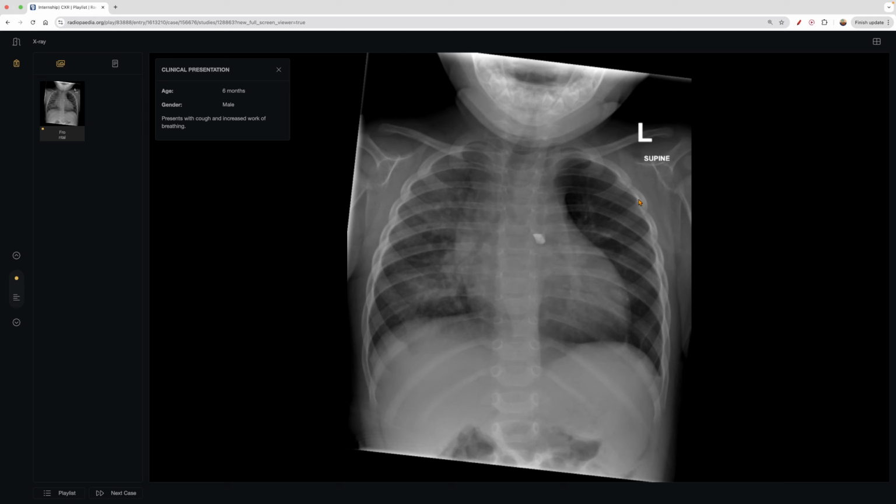And so with that being said, you can see this lung looks a little different compared to this lung, right? How would you describe it? I have you think about it because you already know the answer to what's going to be coming up here, which is that this is all air.